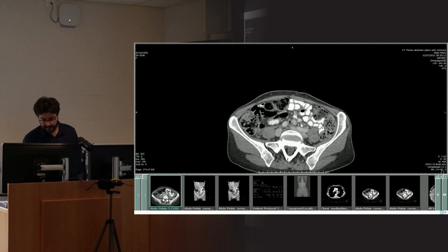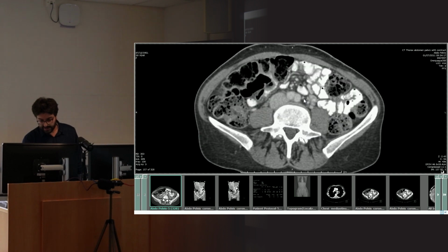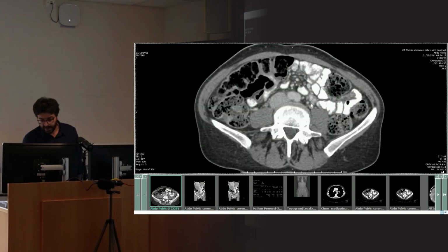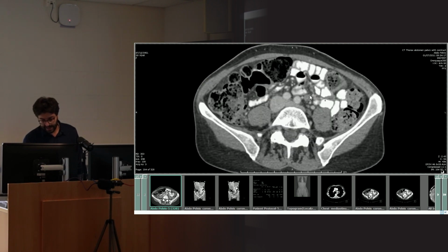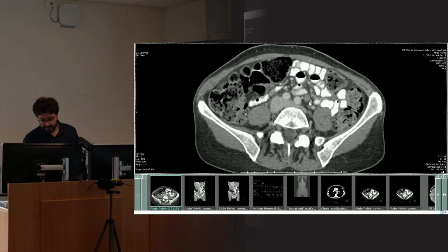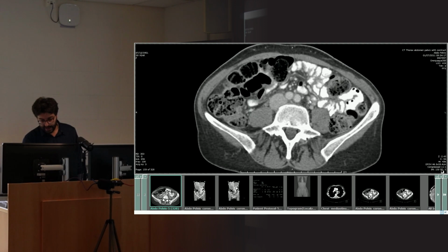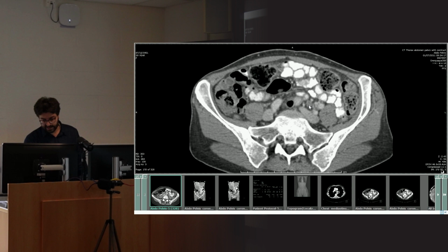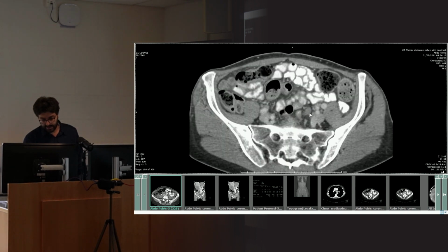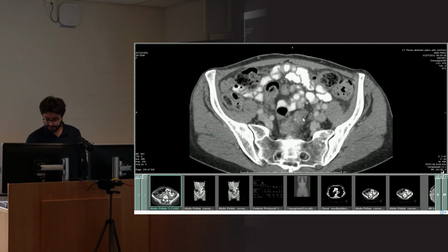And then the other interesting thing here actually is if you're following the vessels, this is the inferior mesenteric artery, this is the inferior mesenteric vein, or at least a branch of it. If you look at that vein, as it comes here, the vein is expanded and actually stops enhancing like other veins. You see that? You've got a branch that comes off there, and that branch then stops enhancing and expands. So what do you think that vein is full of? You can actually see it's a big expanded vein coming down towards where the tumor is. What do you think that is?